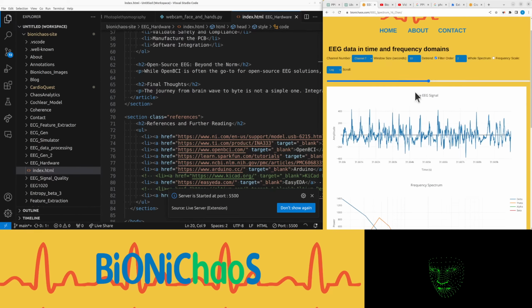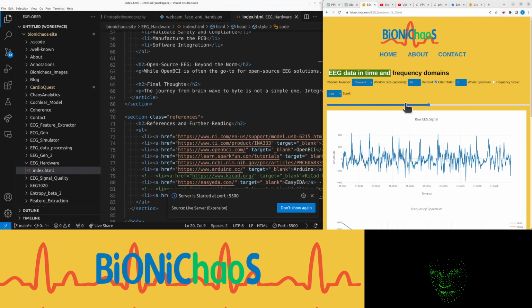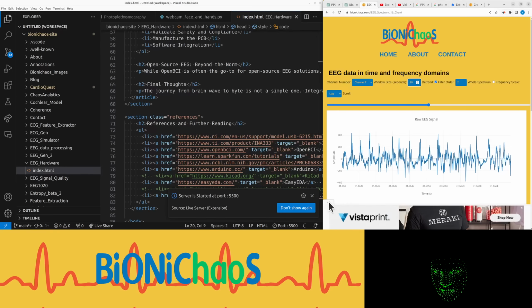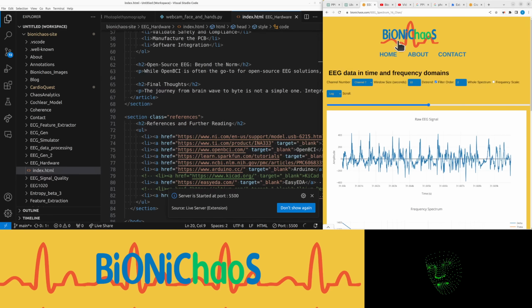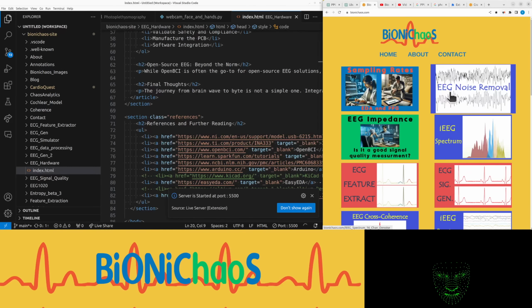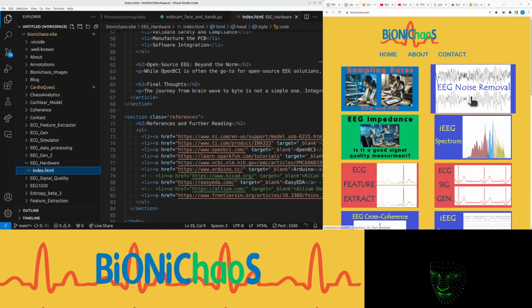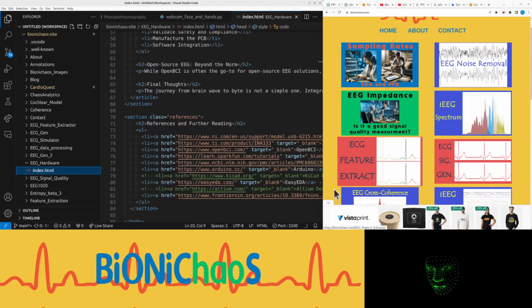Yeah, this application is an earlier version, so a simpler version of the EEG data time and frequency domain. It's just scrolling through the file. You can select your channel, seconds, same as the previous tool. The newer tool, this one here, obviously also has options to make the signal less noisy. You can play with that.